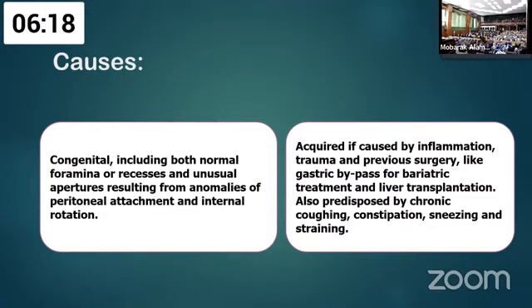This is more liable to strangulation and ischemia. You must note that CT scan cannot detect peritoneal and mesenteric ligaments unless they are outlined by ascites. CT evaluation of internal hernia can be negative during a symptom-free interval due to spontaneous reducibility of the hernia.